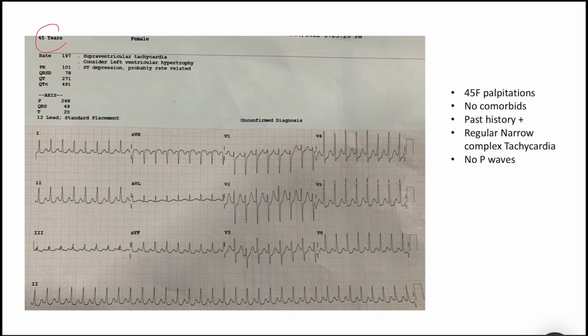This ECG belongs to a 45-year-old female who presented to the ER with palpitation and uneasiness. She had no known comorbid condition and was otherwise healthy. She reported a similar episode 2 years ago that had resolved spontaneously. However, this time the symptoms persisted for more than 6 hours, prompting her to seek medical care.